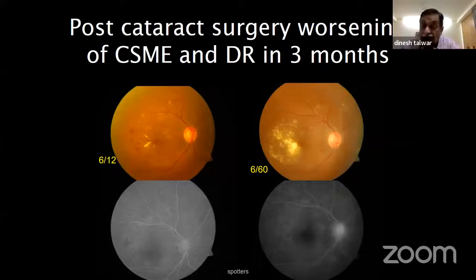Use that in every case, whatever the disease. DME is just one example. In every disease, every case, every patient is a story. Build the story, and every component of the patient's findings should fit that story. Then you will be on the right track. So here, I see cataract not being significant. I see macular edema, which can explain the reduced vision, and the patient needed anti-VEGF treatment.